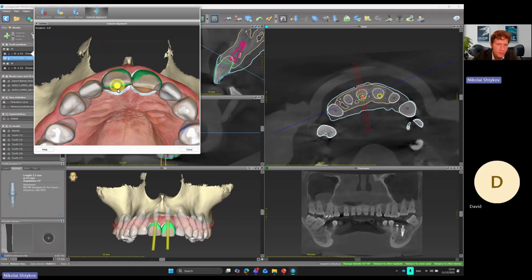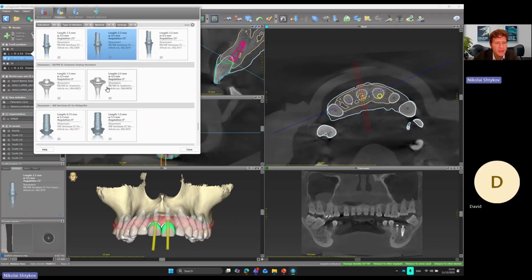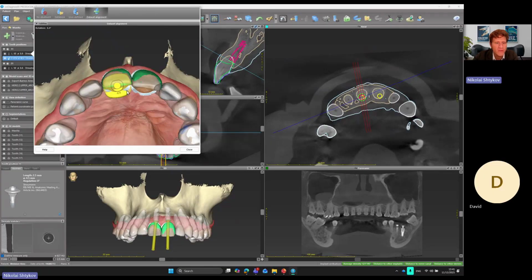You see this small line, maybe it's difficult to see on the screen sharing, but when you make this rotation, I will show you better maybe with something like this one, because it's more visible.